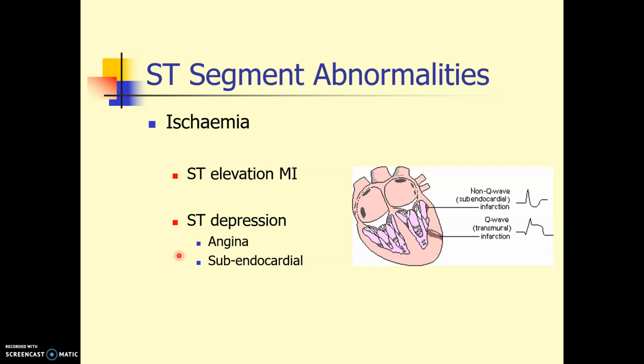So, ST segment changes in transmural infarcts are usually ST segment elevation. There are some things called STEMI equivalents, and these are usually associated with transmural infarcts that are not in areas primarily served by any of our standardized leads, or due to critical ischemia, which may not yet be transmural, but if left is most likely to lead to infarction, and therefore treating them as a STEMI makes sense, even though they don't quite fulfill the criteria.